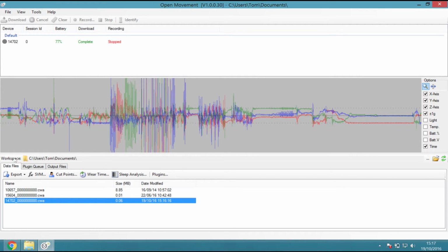And a word here about the workspace that we're in. You'll see here that it indicates a directory name on the computer that the files have been copied to, and the ones that it's currently showing you. So on the right hand side of this workspace area, there are 3 dots which allow us to change the working folder that we're using. So if you'd like to use a different folder, you can click on that.